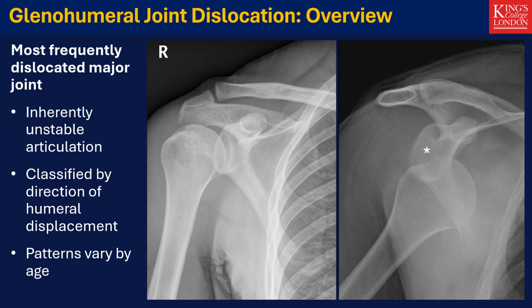of the proximal humerus. Your first responsibility with any trauma radiograph is checking the alignment. Before analyzing fracture patterns, confirm whether the humeral head is centered on the glenoid. The image on the left demonstrates a normal shoulder. The right image demonstrates a classic anterior dislocation of the shoulder on an AP radiograph.